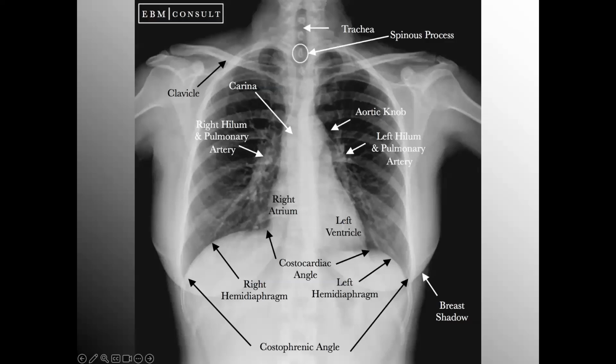Now here's a great reference of some of the most common landmarks which all clinicians should note when glancing over a chest x-ray. Now I realize many times, particularly respiratory therapists, we have but only a moment to quickly evaluate our stuff, right? I mean, I'm there, ET tube, we're looking at lung fields, and then we must move on to something else. But I would argue that it doesn't take more than a moment or two to scan over a chest x-ray. Particularly with a little practice and experience, you can pick up on quite a lot, but a systematic approach is best.